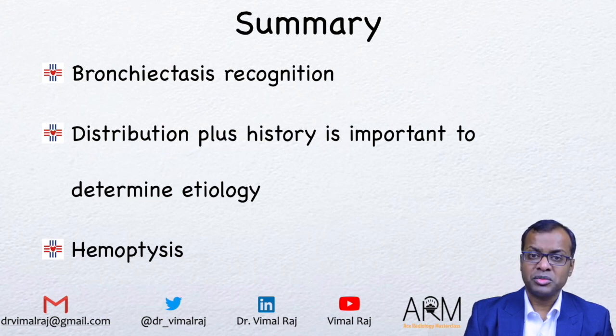Finally, patients who present with hemoptysis, you need to make sure that there are no bronchial artery collaterals or aneurysms in the areas of bronchiectasis accounting for hemoptysis.